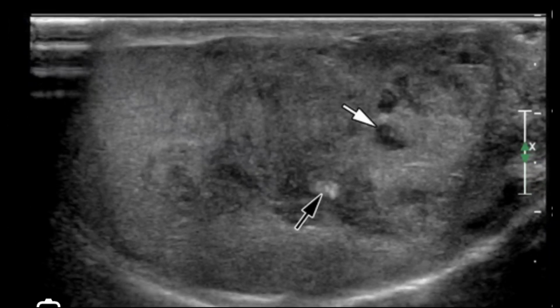As far as echogenicity is concerned, it is heterogeneous echogenicity. However, seminoma mainly happens to be hypoechoic, but in rare cases it may appear heterogeneous. This could be because of some lobulated nodules within it, which are not clearly visible in this slide. I'm going to show you the lobulated confluent nodules in the next slide.